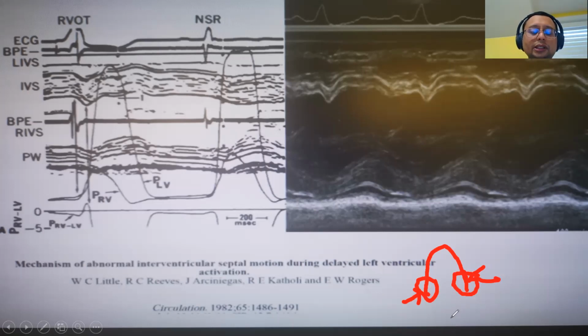You see a phenomenon in echo called a septal flash. During systole, very early, you can see the septum contracting way too early. You also see apical rocking. You can see the movement of the apex go from here to here, so the apex moves like this. And you can see septal flash. That is the LBBB appearance in the left ventricle if you see it in 2D.